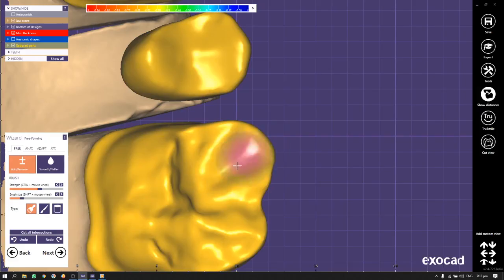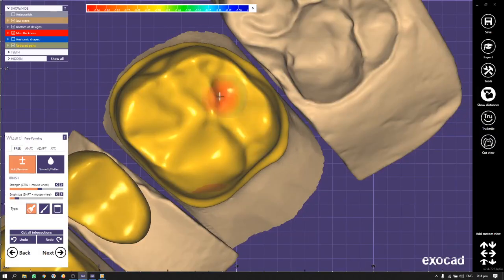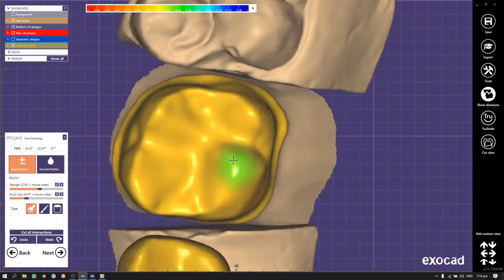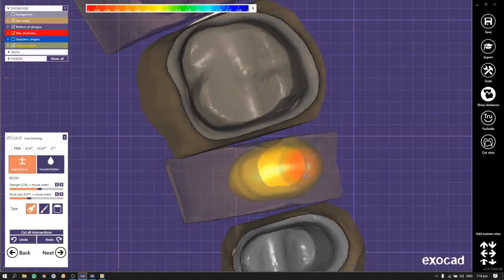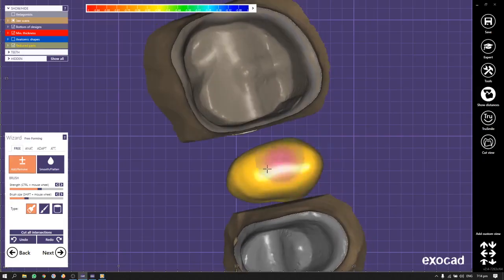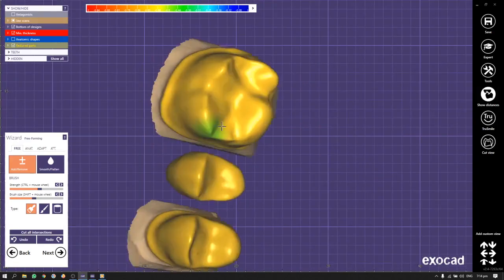So I didn't go too much from the size that the program gave to me, but made this crown more smooth. Here add, remove, add, smoothen, add, smoothen, add, smoothen it out. Circle area, you can choose either the zirconia will make contact with the soft tissues or make clearance, the gap for the ceramic. I prefer the contact with the zirconia of the soft tissues. So that's how I'm filling it in. All these transitions I'm doing also as smooth as possible.